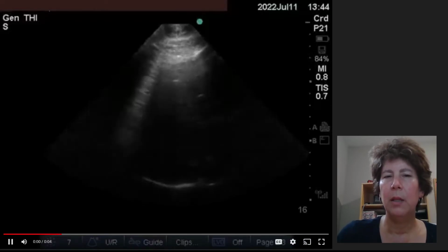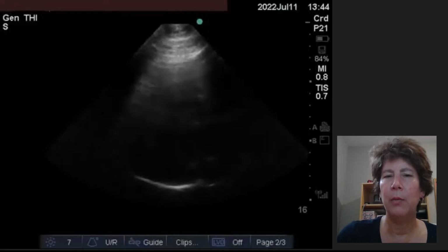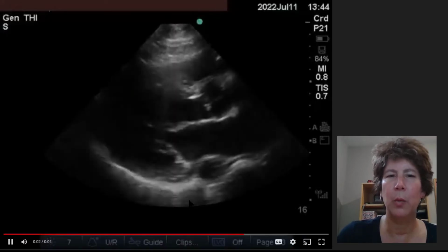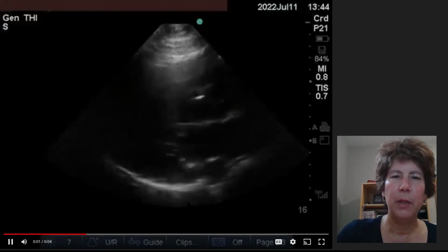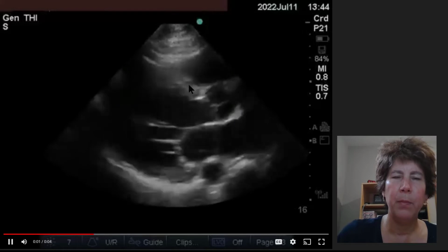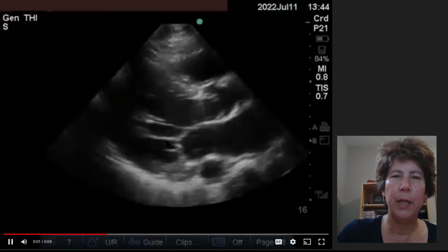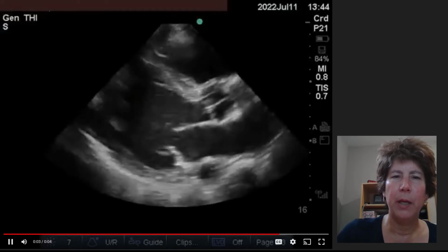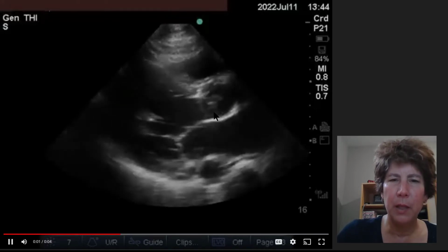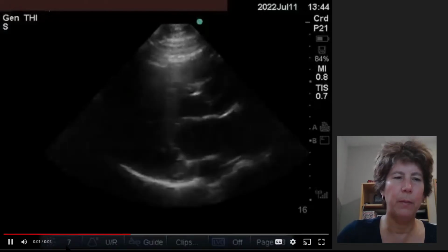And that's either the mitral valve having pathology, or this patient has a very low flow state, and that's why that mitral valve isn't opening. The rest of the ventricle, we can see a little bit of the base, a little bit of the anteroseptal and inferolateral walls here. RV, we can't really say much. And the aortic valve does look nice and clean in some of the views here, and it looks like it's opening well.